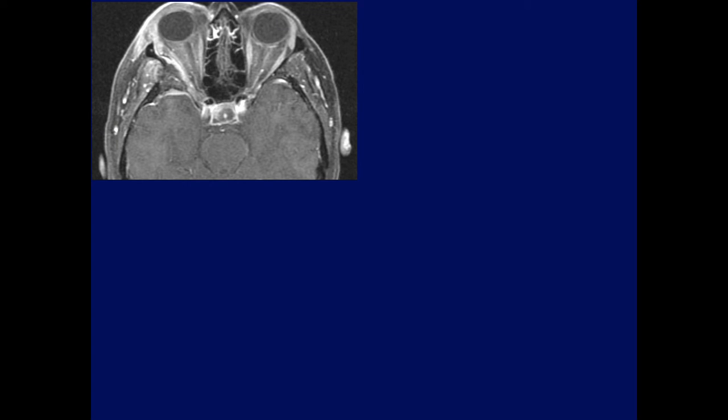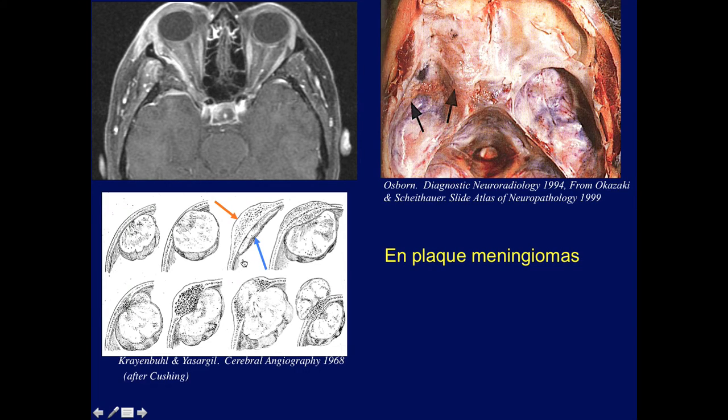Okay, what's wrong with this case? Very good. As Gino says, en plaque meningioma. Correct. Let's talk about en plaque meningioma.